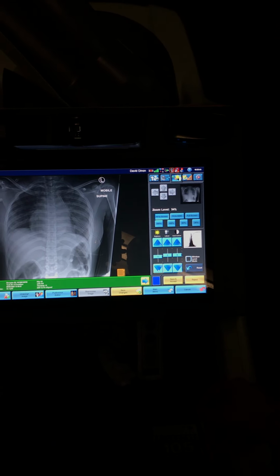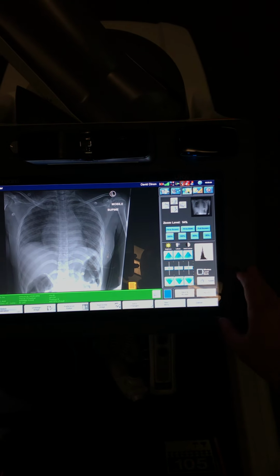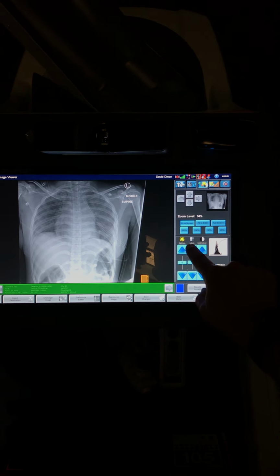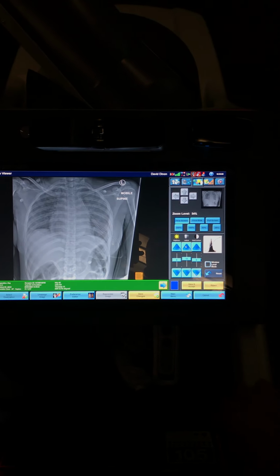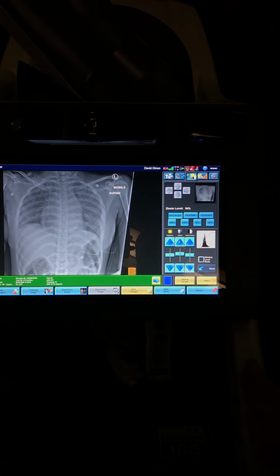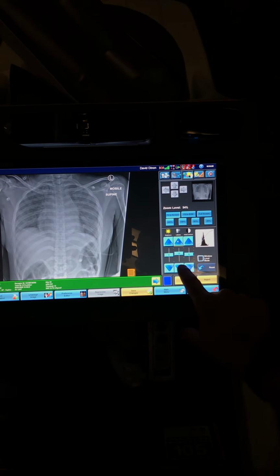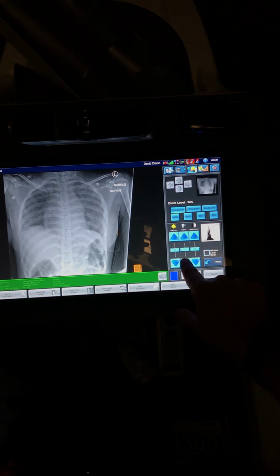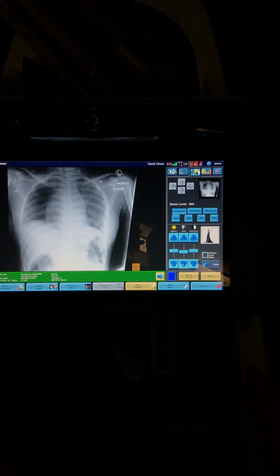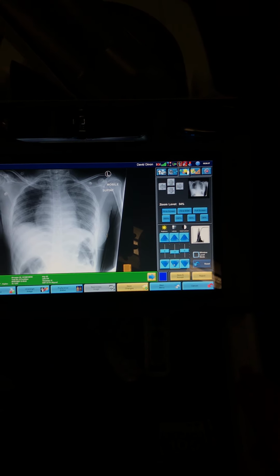And the position of the curve on the histogram has changed. I can reset that back to my last saved position. I can play with latitude. If I increase latitude, the curve has now become flatter. There's more shades of grey in the grayscale displayed, so each step is a smaller step. And if I decrease my latitude and go back beyond 0, it becomes a more contrasty image with less shades of grey available, and hence the curve on the histogram is now much steeper.